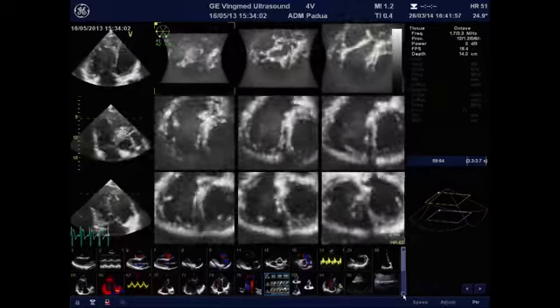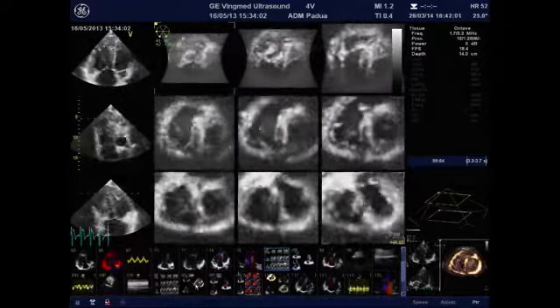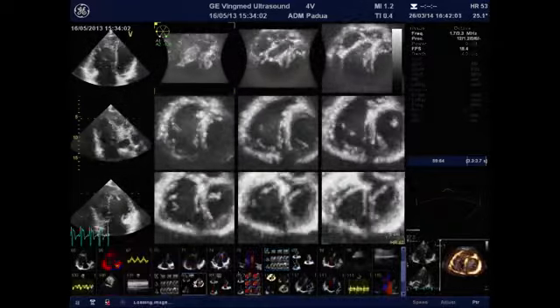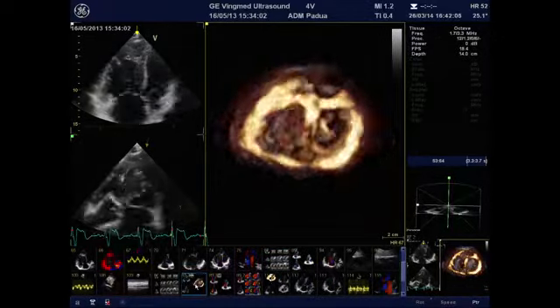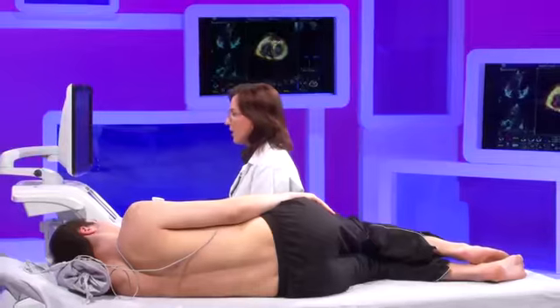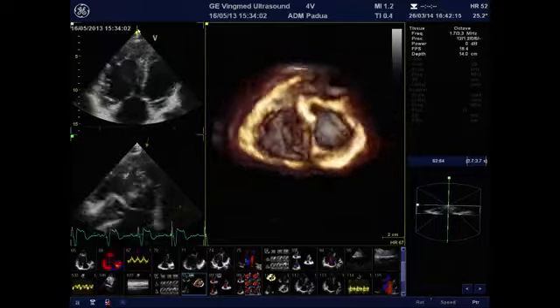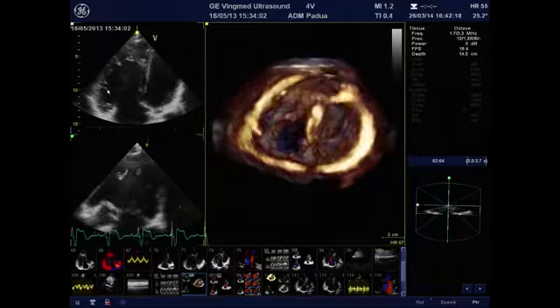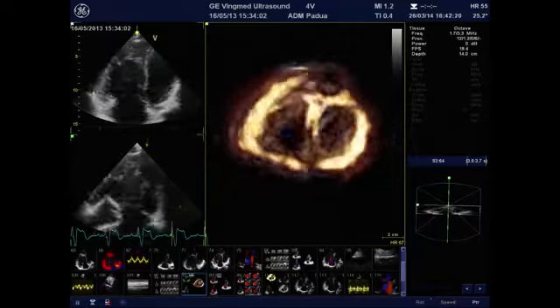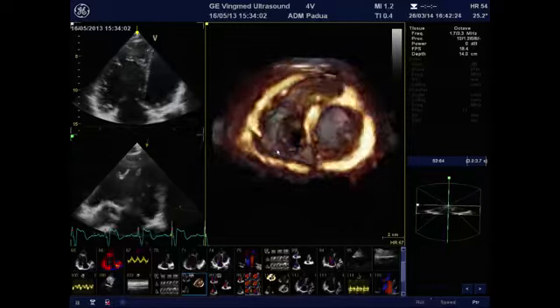Then, if you would like to use this acquisition, you can appreciate from the same data set also the morphology of the tricuspid valve. Here is the tricuspid valve as seen from the apex. The arrow that you can see here indicates your point of view, and the transversal dashed line indicates the position of the cropping plane. So we are seeing the valve from the ventricular perspective.